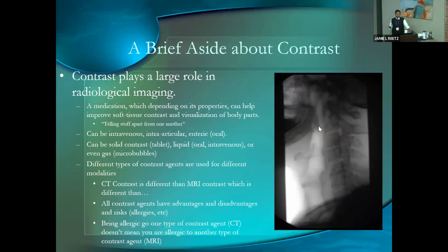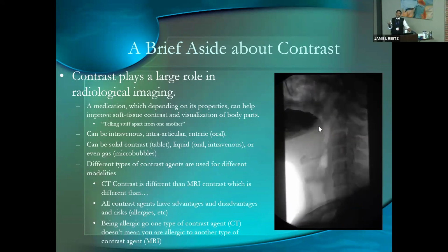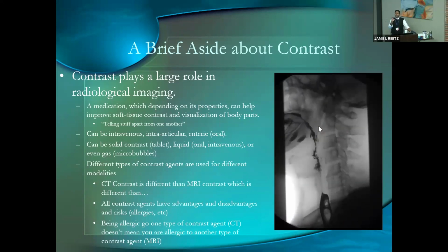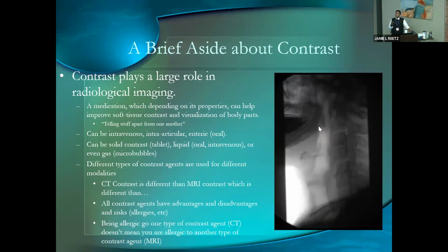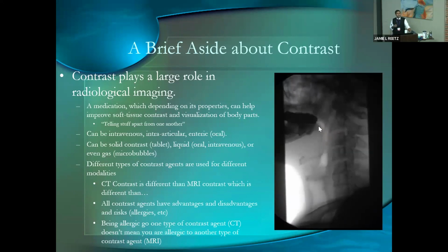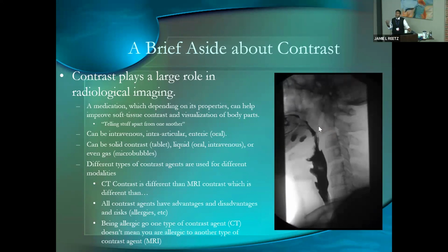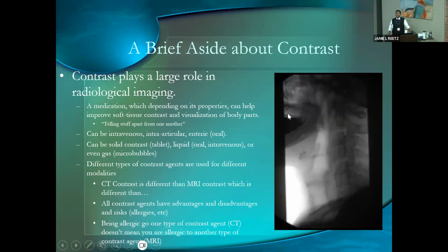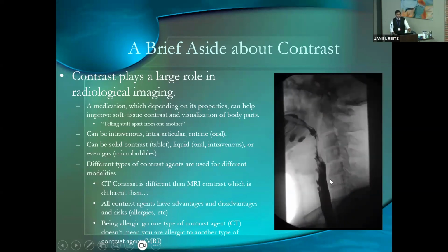Even in contrast-enhanced ultrasound, unfortunately my movie wasn't playing, the contrast is microbubbles of nitrogen that look really funny on ultrasound, but they mimic blood, and that's how you get contrast on ultrasound. Here you can see an image from a fluoroscopic study of a patient drinking barium. I can't see the patient's throat or swallowing mechanism very well, but if I give them barium, it outlines those structures, and I can see this all very well. That is the idea of contrast.